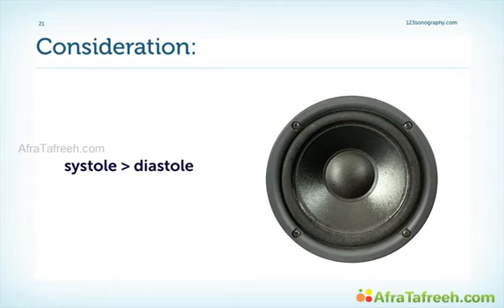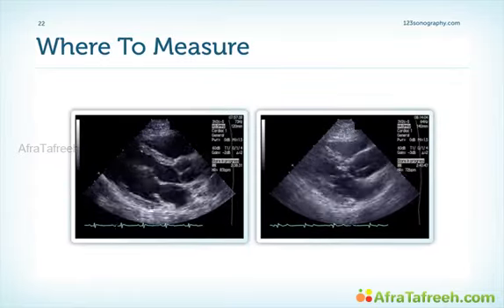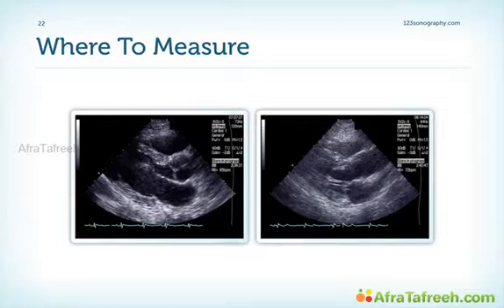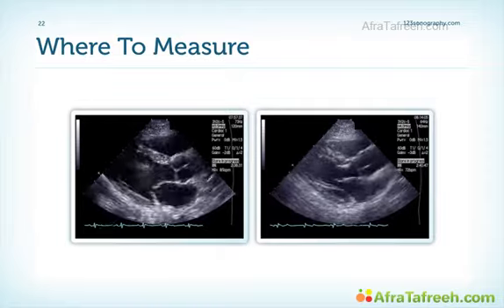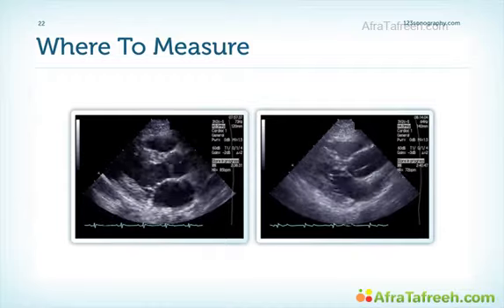One thing to consider, the aorta changes its size. It is a pulsatile structure, and it is slightly larger during systole. Here's an example how to measure. These are two image loops, one showing more the proximal portion of the aorta, and one more the distal portions. You do not have to measure the entire aorta in one loop. You can of course switch image position to optimize the view to visualize the segment that you want to measure best.